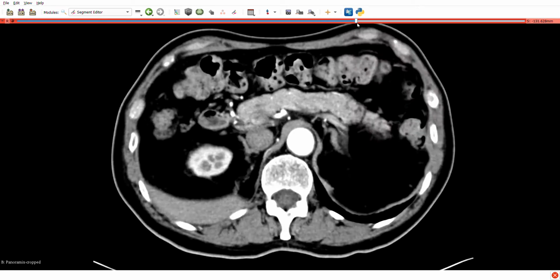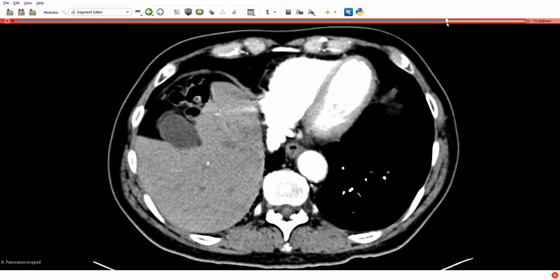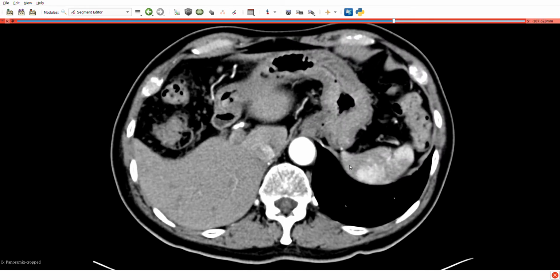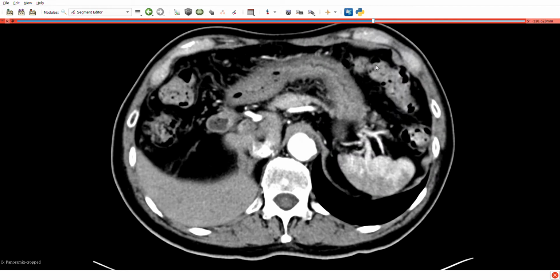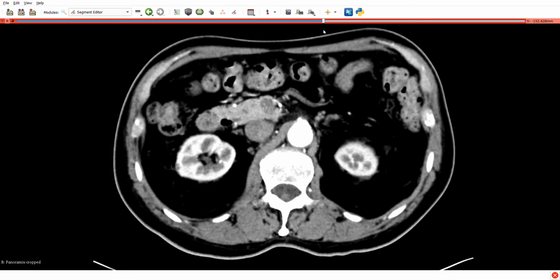And then on the left hand side, where we had the liver on the right, we have the spleen on the left. So here is the spleen on the left, and the spleen sits very close to the splenic flexure. The splenic flexure of the large intestine connects to the transverse colon and continues down and towards the pelvis as the descending colon.